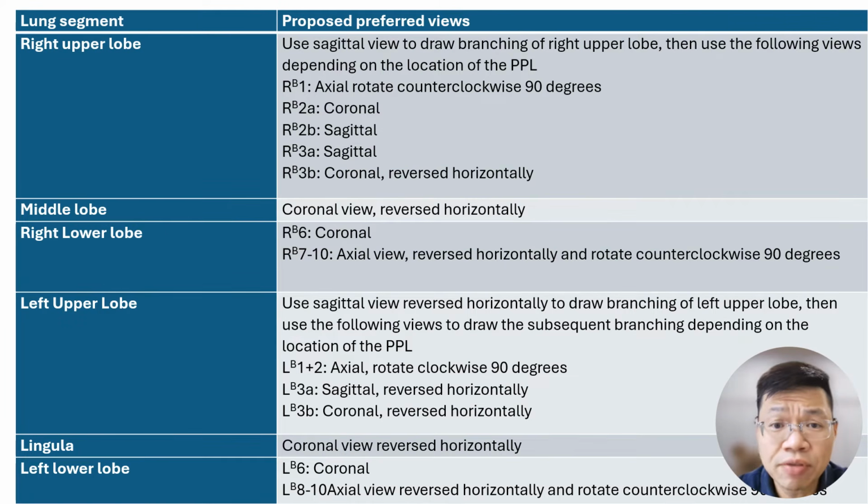In this slide, I have also detailed down some preferred views depending on where the lesion is located. The views to be used should be intuitive based on the direction of airway travel. You may find that in some cases, concurrent use of multiple views is required for airway mapping. We will now move on to some case examples so that we can put into practice what we have learned so far about airway mapping.